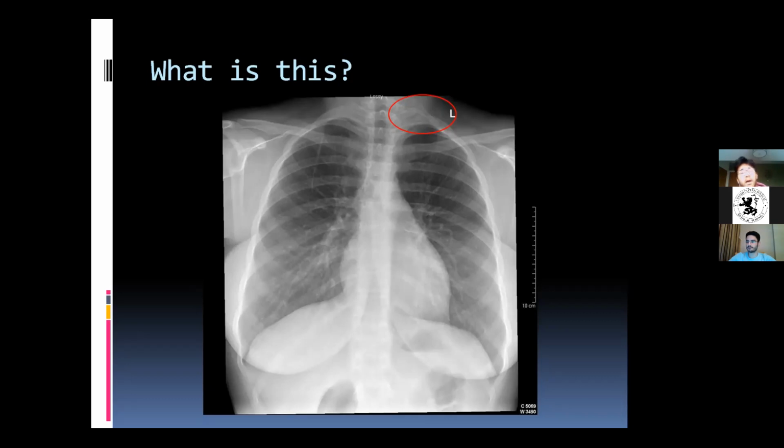Okay, and this is not her X-ray, but I tried to find an X-ray that is close enough. She had a left-sided cervical rib, and the syndrome that it causes is, as rightly as you mentioned, thoracic outlet syndrome. Thoracic outlet syndrome can manifest itself in a variety of symptoms. It can develop into neurology if the brachial plexus is very badly compromised, and at the same time, doesn't matter at what stage they're in, it is an emergency and you do have to treat it.